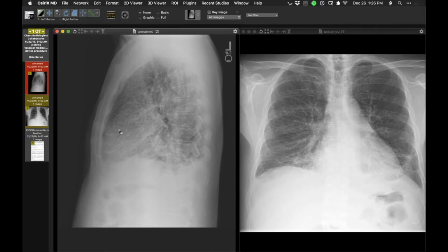Yeah, I just put it in the report. I think this is common. One of the ways they get them down is they do a little saline injection to fire hydrant it back down, or fire hose it back into the right place. Exactly. That's what they do. If it's flipped up, that's what they always start to do.